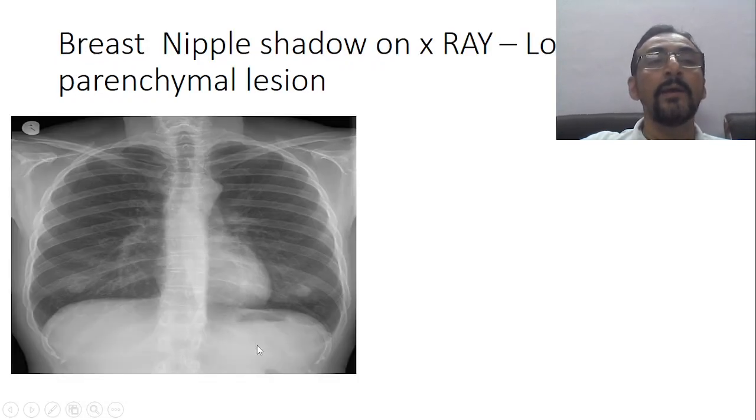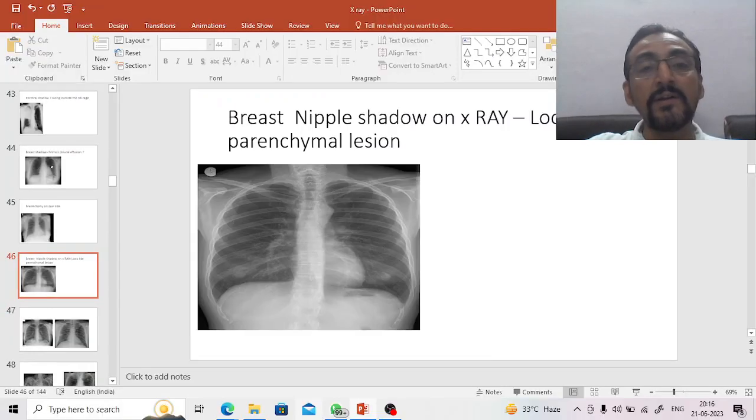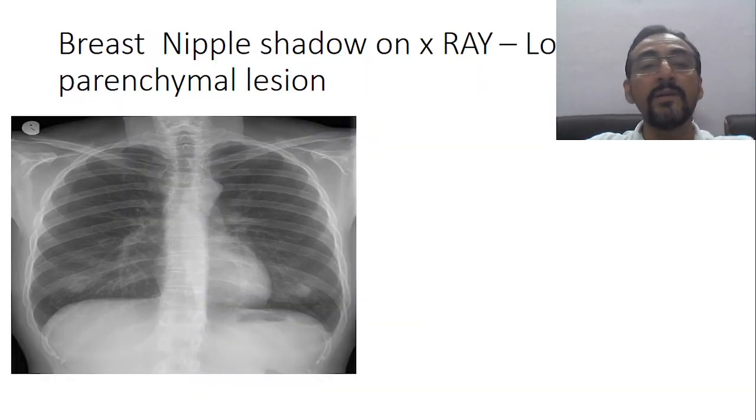Okay. Now there is one more important finding, especially in females. Now, breast nipple shadow on the X-ray.